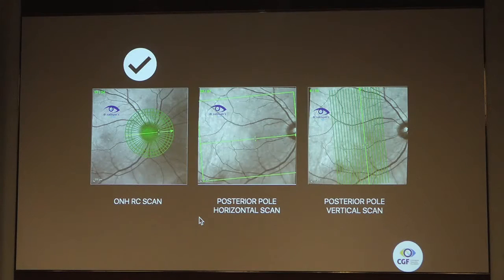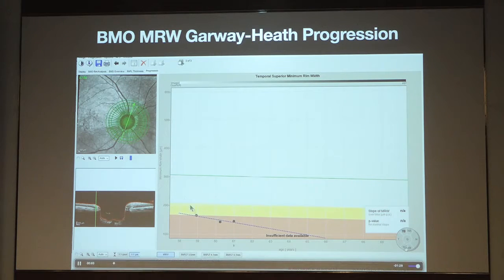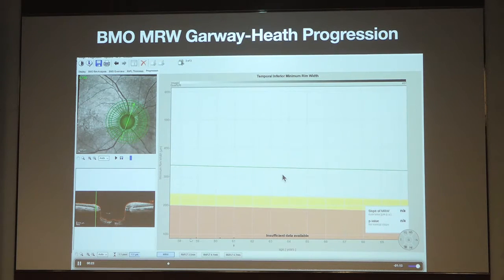The thickness, is it the same? Is it the same that is happening, or is there a change over a period of time? You can have multiple follow-ups, and then you can see what average thickness it is maintaining. That is a normal thickness. If it is something below, then you can understand there is a real defect happening. It is easy for us to understand, but the reason I am emphasizing is that in your system, when you have the printout, you cannot have so many printouts to understand how the progression is happening, because for each area you can click and see what is happening in each zone.